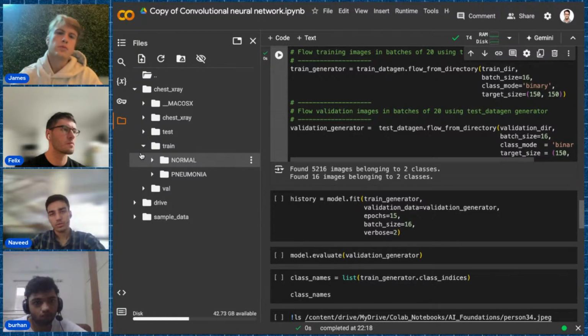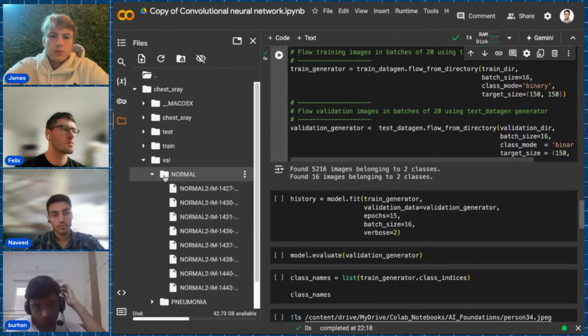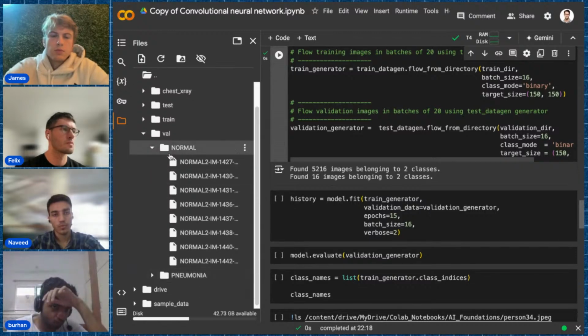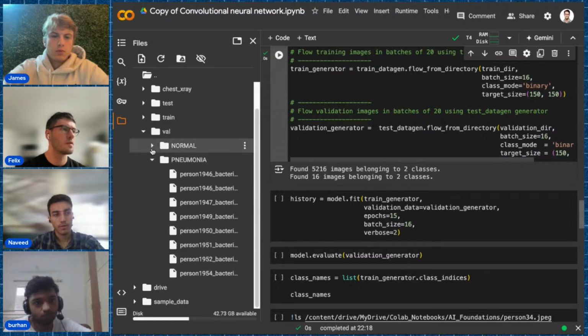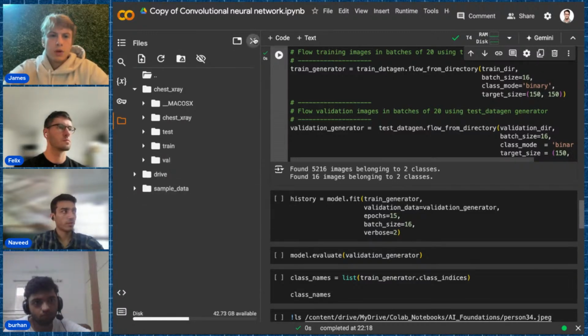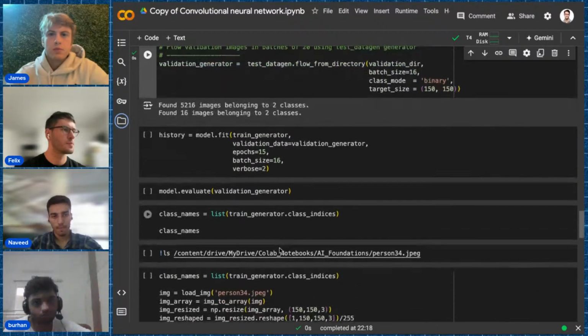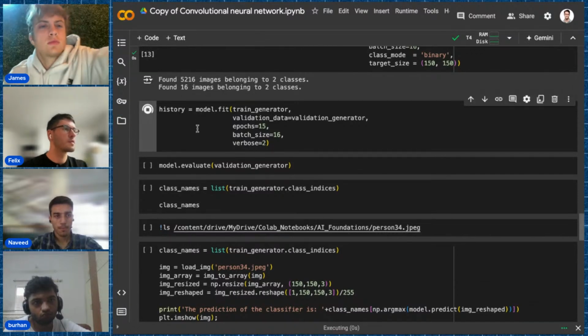What we can do is create another test set inside our training set. That would require some work, it's not much. But they have provided the split beforehand, so let's work with it, and then maybe later on we can create another split inside our training set. This one is going to take a while. All right, I'll run it first.